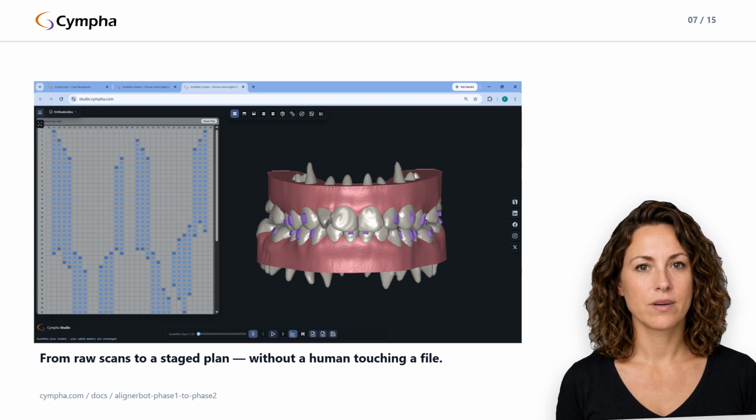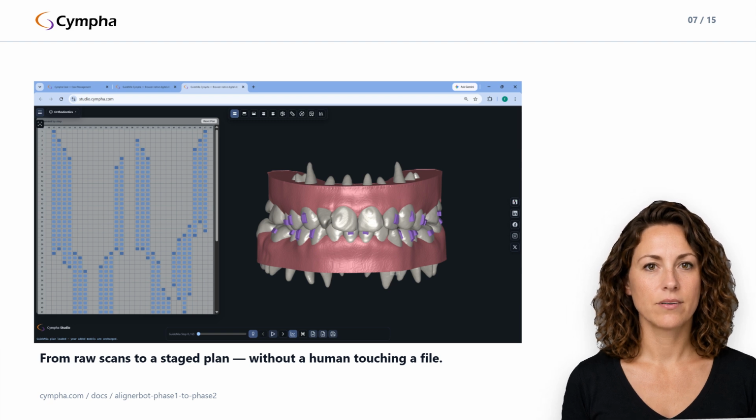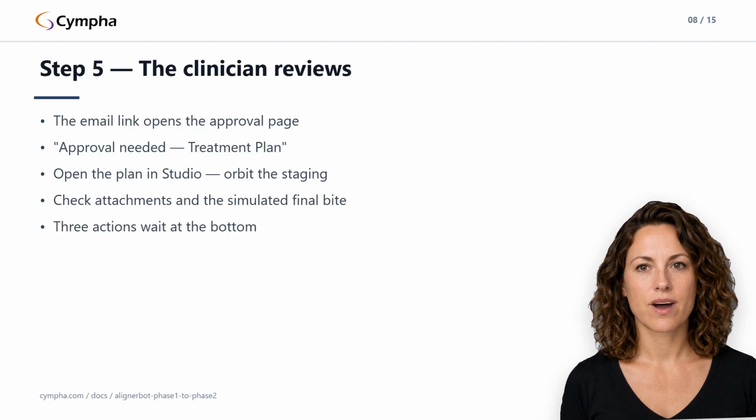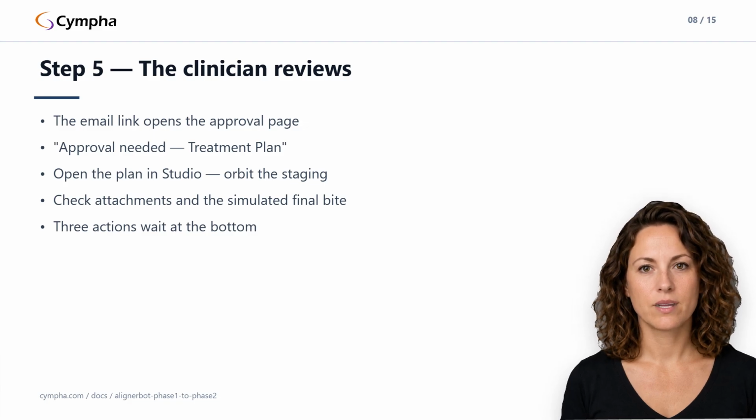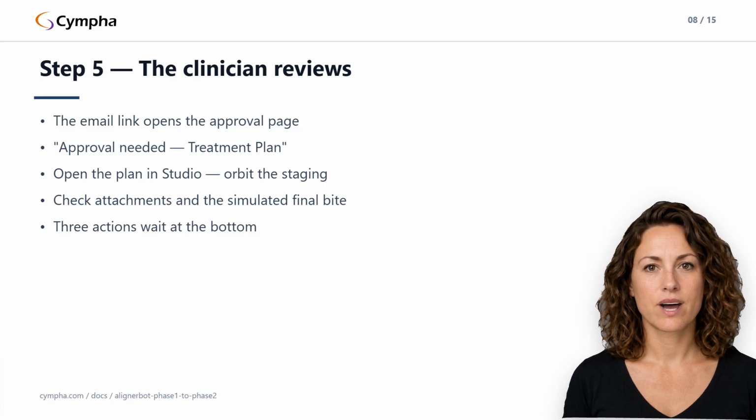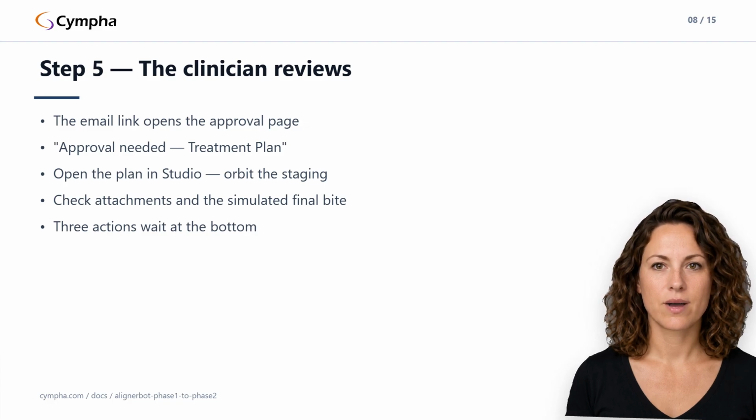Door 1, the clinician approves the plan. The status pivots through approved and, because an approval cycle still remains, drops straight back to designing, with the same AlignerBot seat holding the case. On the agent's next poll it claims a fresh dispatch log, and this time it launches OrthoPlus in appliance mode. Phase 2 runs the appliance design cascade, generating whatever the case's design kind calls for: aligner models, an arch model, a bracket bonding guide, or treatment plan only.